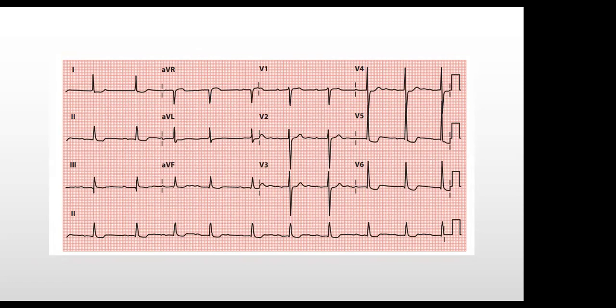What do you think? So ST segment depressions. They appear, I don't know if we can describe this as a smiley appearance. So that may speak for digoxin effect or probably ischemia.